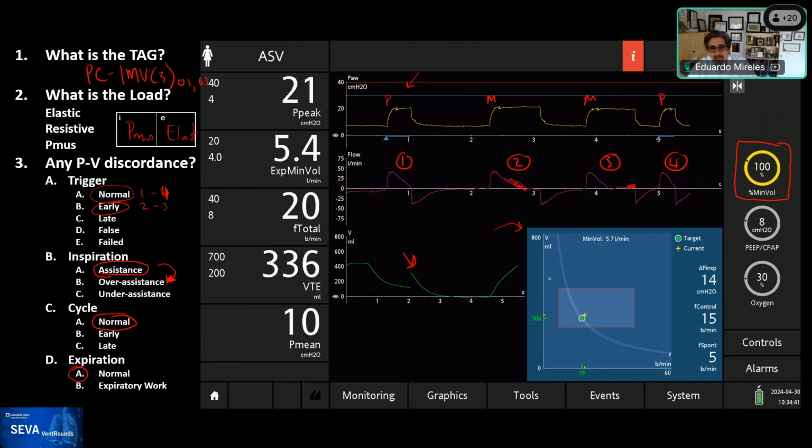So this is the graph that I think is very helpful for me to understand the optimal breathing pattern. It is simplified by this curve that you see here, which is the relationship between frequency and tidal volume, and finding an optimal point calculated by the equation of Otis and Mead, that little point you see in green there, which would be the minimum amount of work, and essentially the minimum amount of power for this mode.